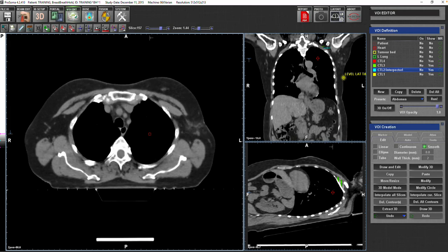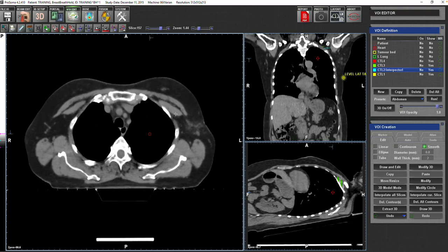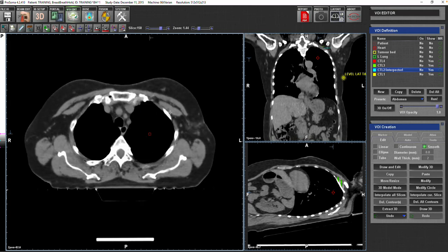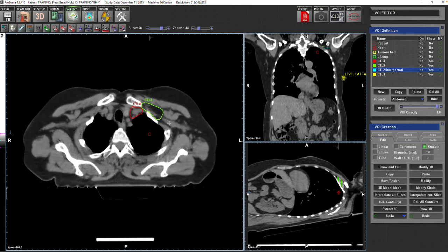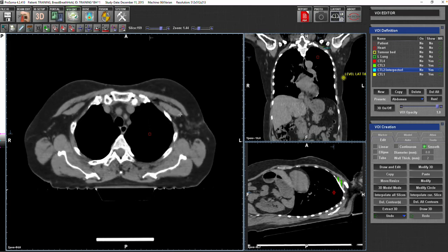When you see the pectoralis muscle going to be inserted into the rib, the space is getting narrower and narrower. And the most important thing I look at is that there are no structures in between the muscles. So I'm sure there is nothing between the muscles. Because if there is something between the muscles, this will be the vein that I want to cover. So I want to go below that, where the space between the pectoralis major and minor is narrower, as well as between the pectoralis minor and the chest wall, which is very narrow.